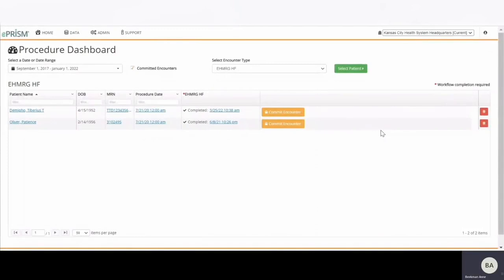And I'm really excited to share with you this demo on code heart failure. As we get ready to start the demo for code heart failure, I thought I'd address two common questions right up front. The first is, what is the risk model you're using? The risk model that runs in code heart failure is the EHMRG model. This model is a predictive analytic tool. The tool has been researched, validated, and published as a trusted predictor of mortality for patients in the emergency department.